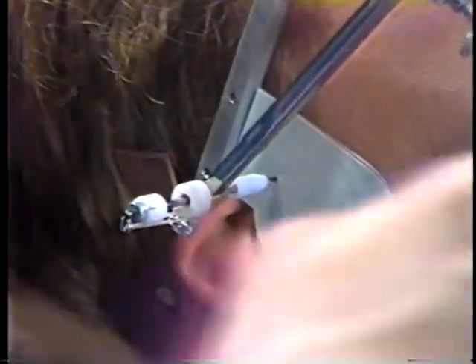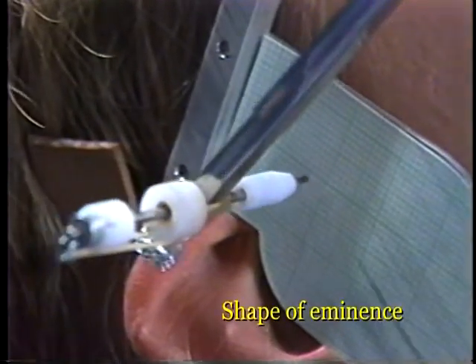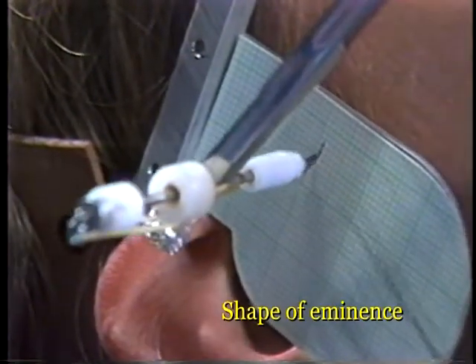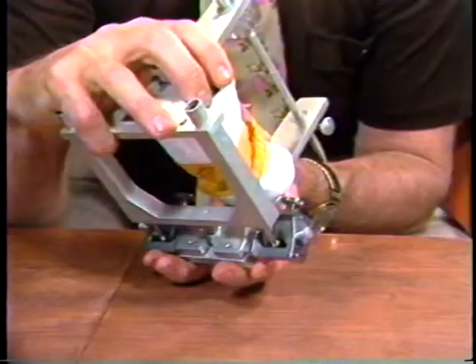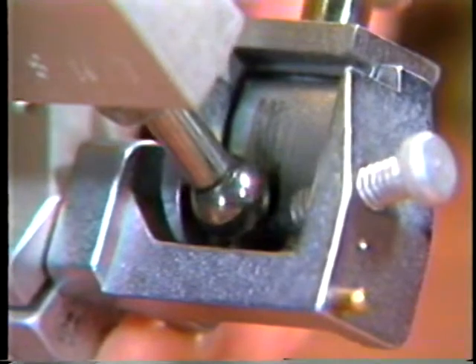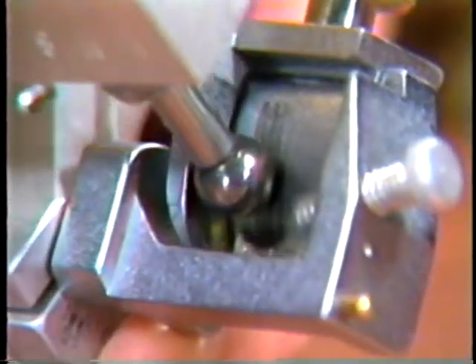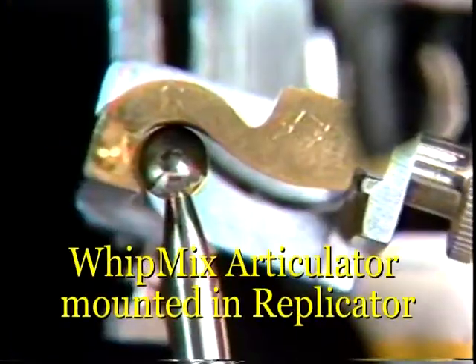The shape of the articular eminence is easily demonstrated by using one of the simple recording devices. The eminence makes up the superior wall of the fossa, under which the disc condyle unit translates. Its curvature shows a fairly constant 3/4 inch radius arc. Its steepness can be adjusted to match that of the patient. Variations in the curvature, although not common, can be reproduced in some articulators.